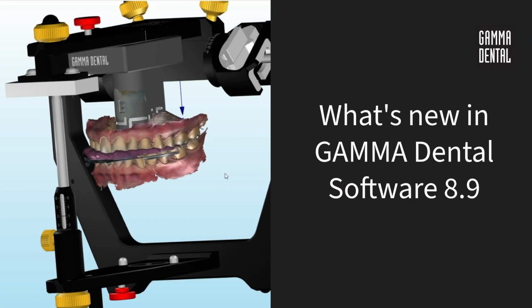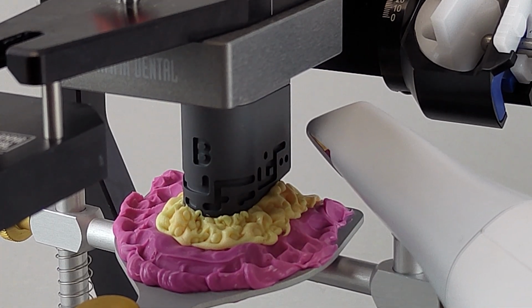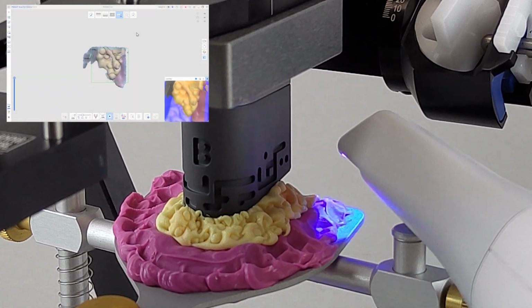Hello and welcome. In this video we are excited to show you the new and improved features in Gamma Dental software version 8.9. One of the key improvements in this update is the new fully automatic alignment of scan data in the Gamma digital workflow.